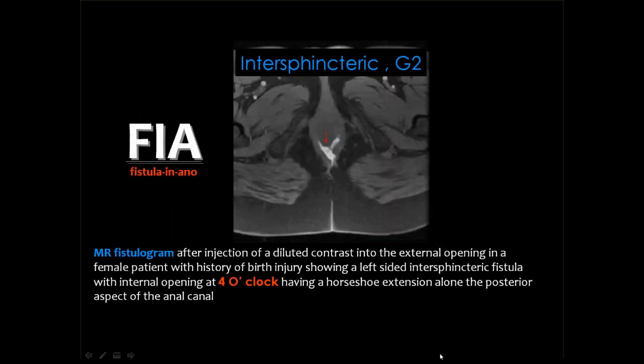And sometimes they use this MR fistulogram. They inject contrast material before doing the MRI. This will enhance, of course, the appearance of the fistula, which in this patient had an internal opening at approximately 4 o'clock.